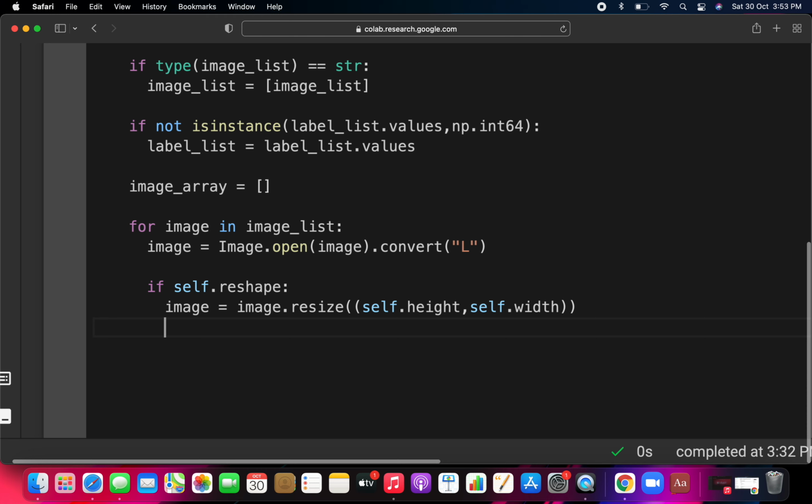Then after that, you will create an array, so that you can convert it that way, np.asarray, that's it, that is what you are doing. And here you will write images, you are just converting images to an array. Okay, I don't think I have made a mistake. I think it's spelled array with a double r-a-y.